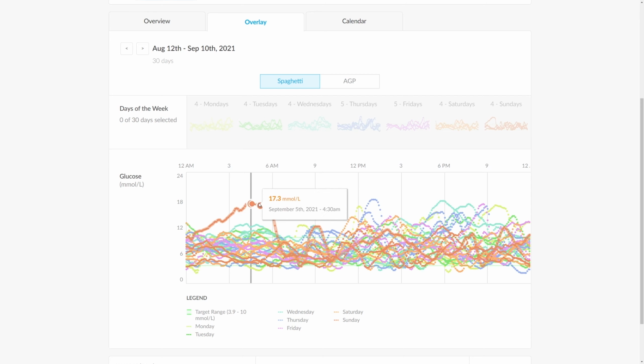So maybe we've got very high readings here, so maybe we want to look more at September the 5th to see what occurred here. We also have this reading where we have September the 9th, and we have some other high readings later in the month. So for instance, that's September the 6th as well. So we can go and review these days. We can look at the control that led to this, the build-up that led to these high readings.